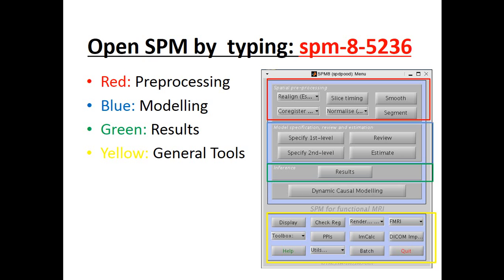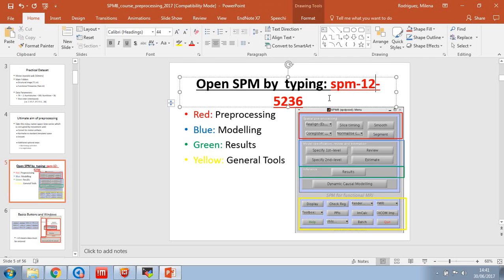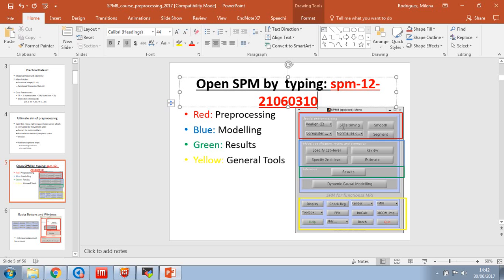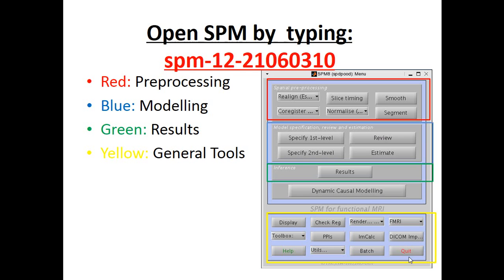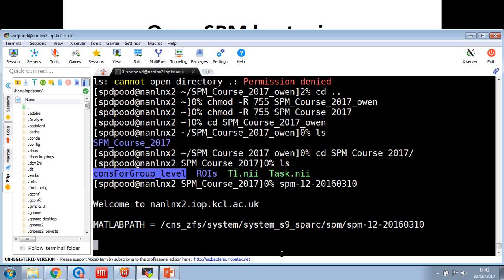Okay, so I thought I'd change that bit. We're going to open SPM, let's change this to SPM 12. First thing I'm going to do, let's open up SPM. We can do this by typing spm12, 2016-0310. And this will take a couple of seconds.